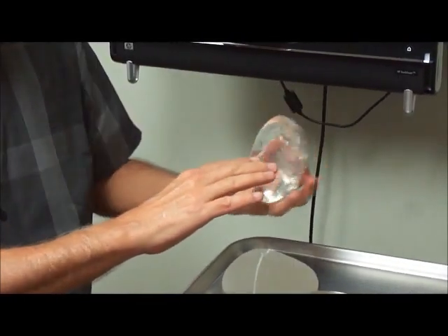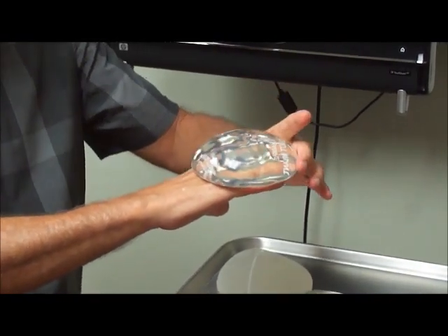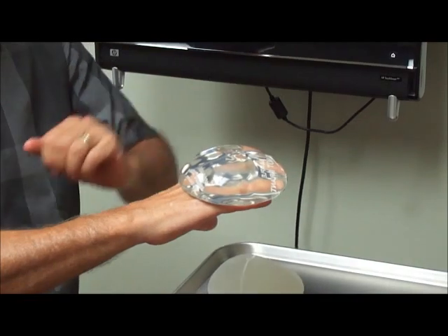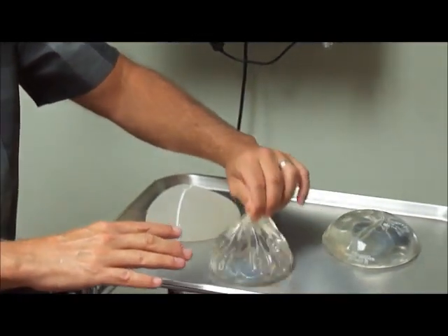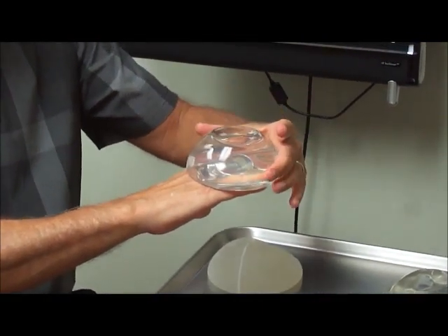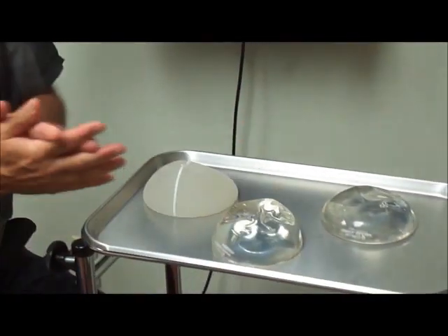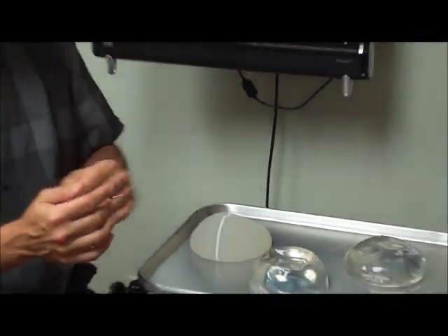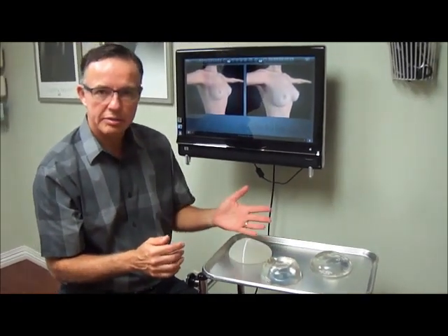As you can see, imagine that my hand is a rib cage that has a certain curvature. So this implant will lay in here and produce a nice curve for breast enhancement. And this one will too. And provided that they're covered with a muscle that will tighten over them, they will reproduce a very nice shape and form. These two implants can also be found in a texturized fashion.